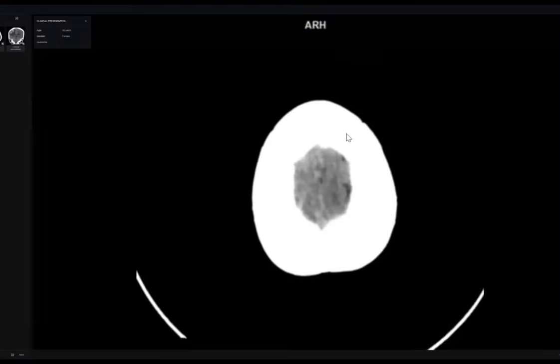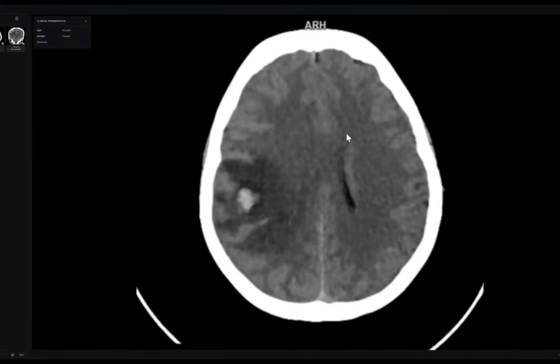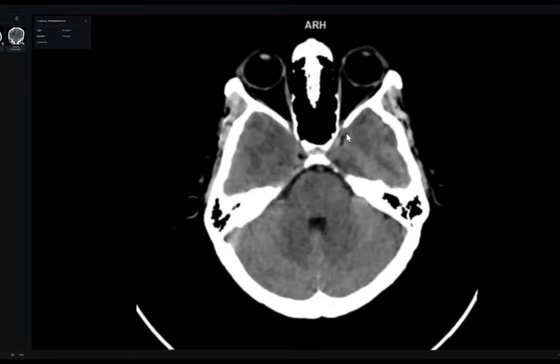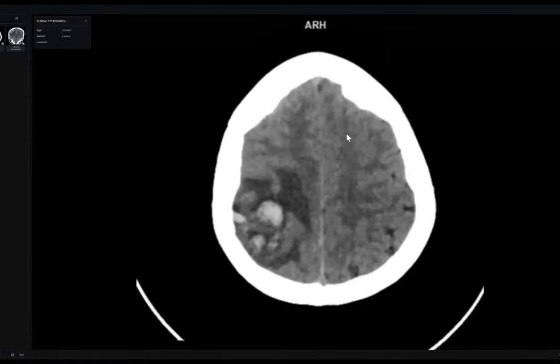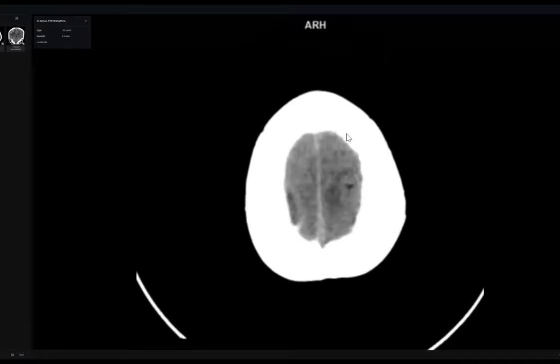Any of them is called reperfusion. Number three, I think in embolic infarction also, it may be associated with hemorrhagic transformation or some hemorrhage. Again and again, when you see any intracerebral hemorrhage like this, think first. Think, go up and down.